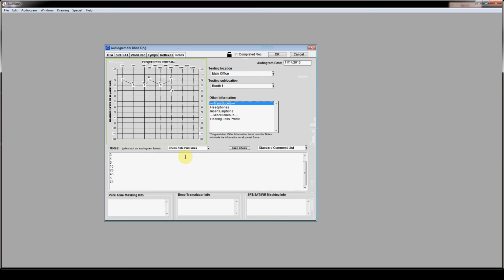So if, for instance, you did your notes and you're really trying to keep it to one page, this feature allows you to come in, click the drop down, select which report you are printing to. Usually we'll set you up as standard style number 2.